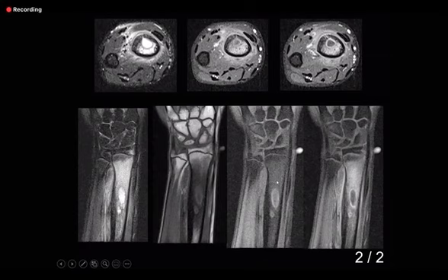This is a fat saturated pre-contrast sequence, and what I have seen is, if you look at the soft tissues here and look at the soft tissues here, you will see that the soft tissues appear slightly high signal as compared to this. So there is a bit of physics there, and many people find it a bit confusing. So develop your eyes on a fat saturated. The same thing will occur in the spine also.